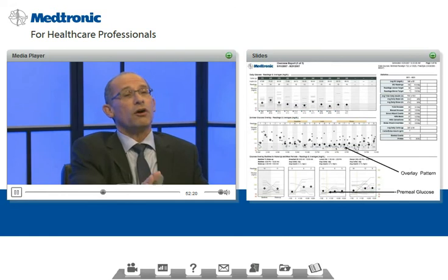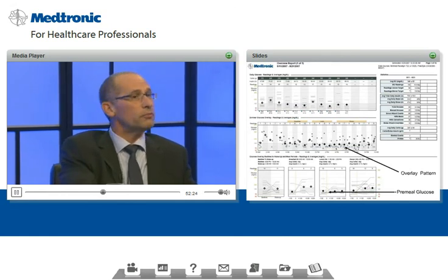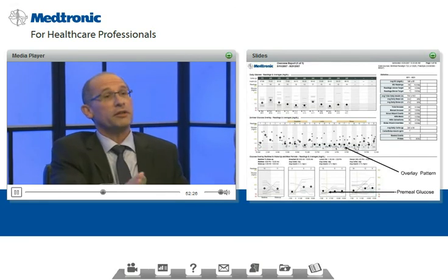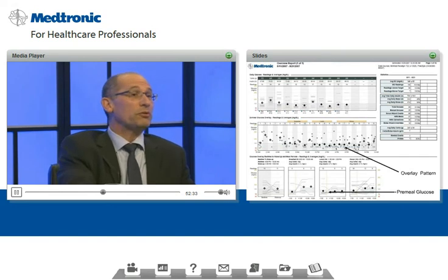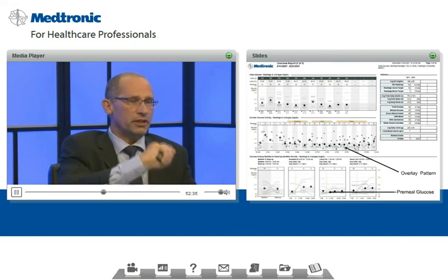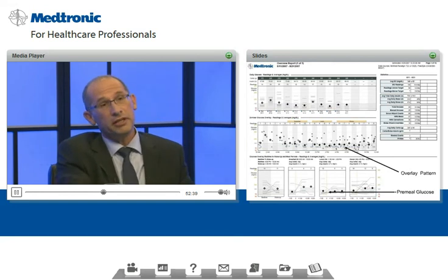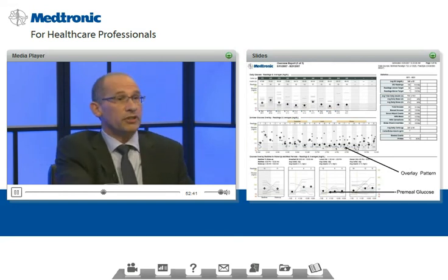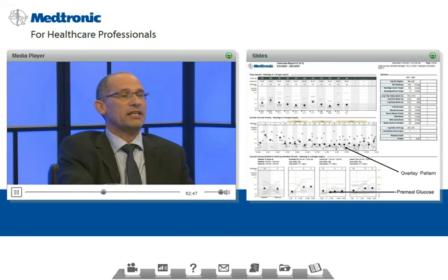So the downloads are also very informative for those who are not using CGM and only using blood glucose SMBGs or blood glucose monitors at home, but they're using the Wizard. In this case, as we see in the download in front of us, you can see again that the patterns during the day look okay, but during the night when the patient was measuring his blood glucose, there is a hint that the basal rate is inadequate, maybe it's lower.